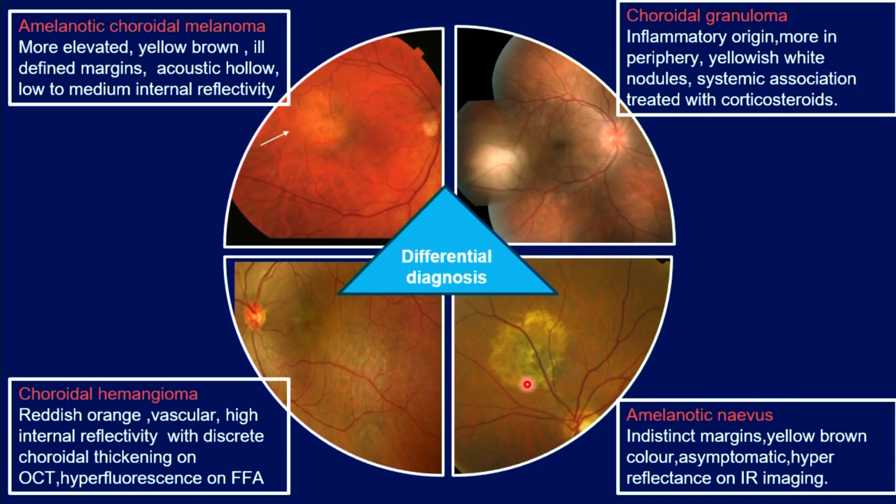Like Dr. VJP asked for the ultrasound, what would be your differential for that ultrasound? Toxocara granuloma. One more thing you can take back is you can read EDI OCT features of choroidal osteoma.